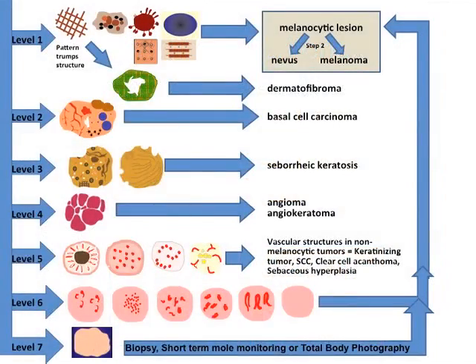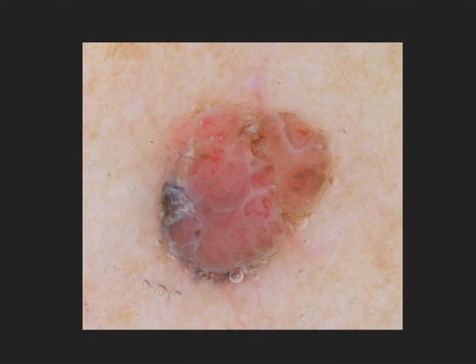Then you have your vascular structures, which we briefly touched upon, and we'll talk more in a moment about those. And so here's a lesion that, if you think about it, does not have any criteria for melanocytic from step one. And again, we'll get through the non-melanocytic in a moment, but basal cell, no features for a basal cell, no features for seborrheic keratosis, no features for hemangioma, and therefore now you're left with looking at the vascular structures, and so here you have these irregular serpentine vessels, those are one of the melanoma-specific structures, and this is a nodular melanoma.